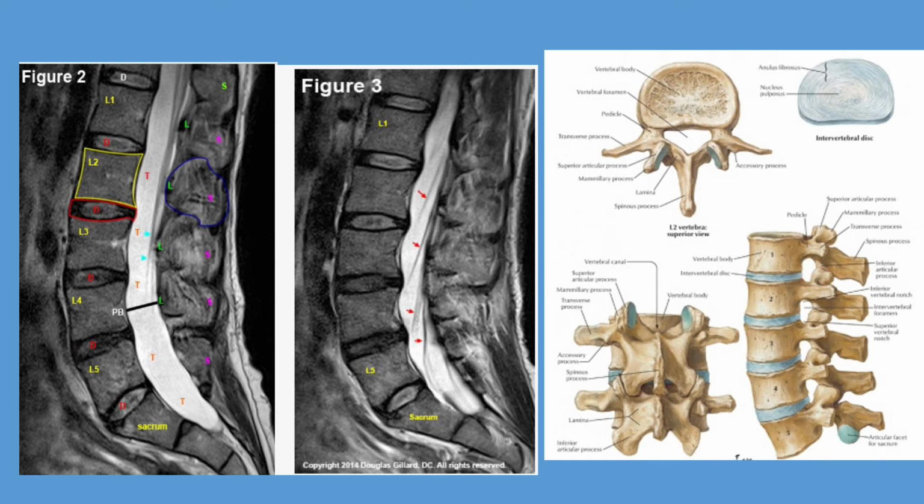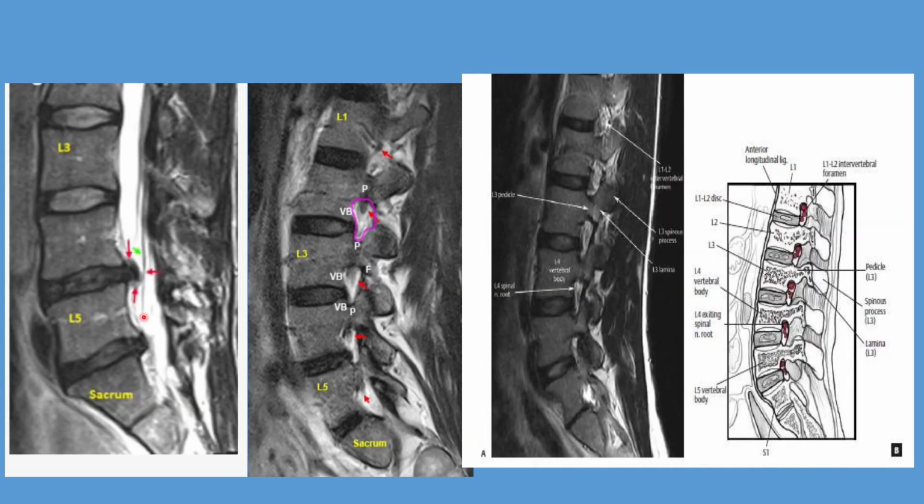Right, let's go on to look at the MRI images. So this is actually a disc prolapse between lumbar 4 and lumbar 5 in your parasagittal cut, which is more clear. And you can even see it is actually indenting on one of the nerve roots, which is usually the traversing nerve root, which is your lumbar 5 nerve root. And this is your foraminal cut, which actually tells you the exit foramen of this particular level.